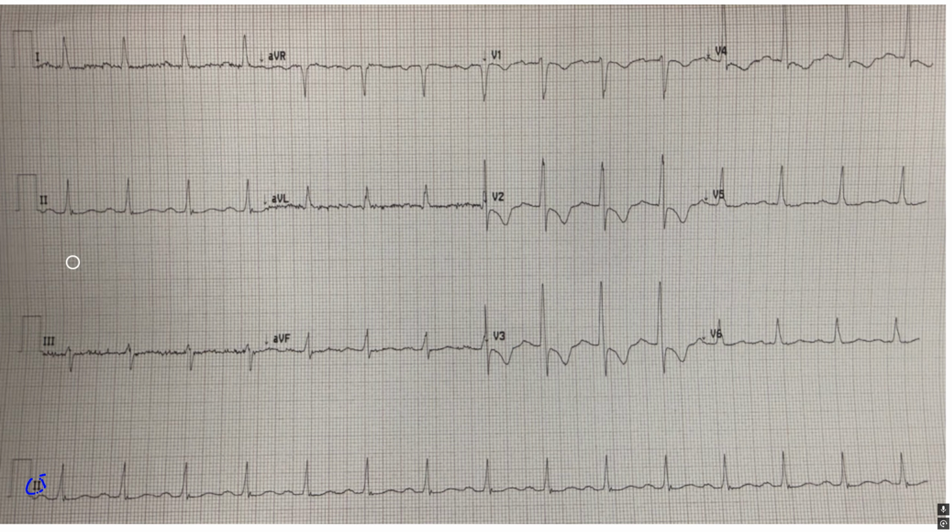This doesn't always happen, but this is an EKG that I don't know where it is from. It's cool that he included these so I know what the scale is. This is a normal scale where this is like 10 boxes. So that tells me that the scale is normal, which is interesting in case you're looking at EKGs from a different country. Who knows? When you'll be in France and this guy's having a heart attack. We need help. And you can be like, yeah, I know what the scale is.